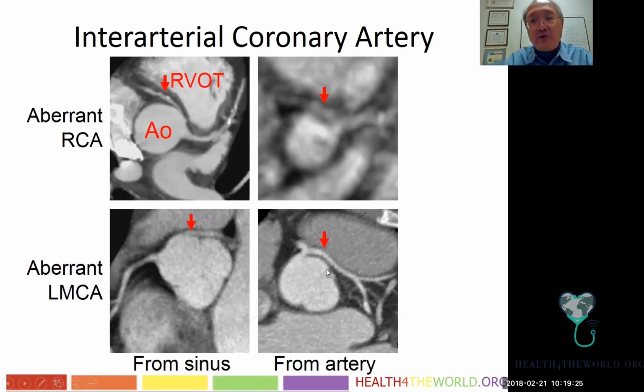So when you do see, either incidentally or while seeking coronary abnormality, a coronary artery that goes in between the aorta and pulmonary artery, typically these are significant, especially in patients with symptoms and especially in patients who are young, in teenage years and young adults in their 20s.